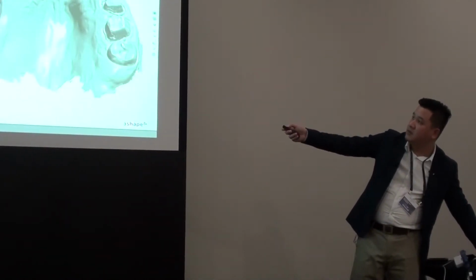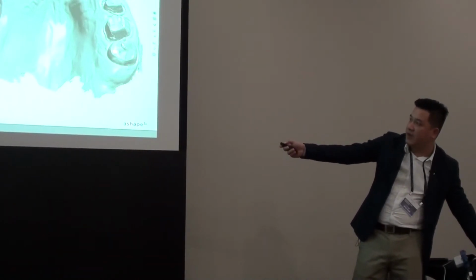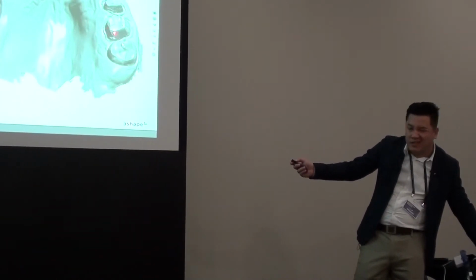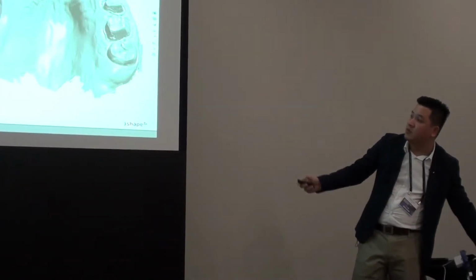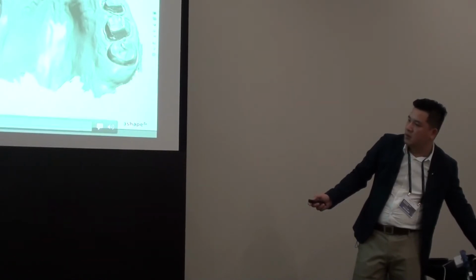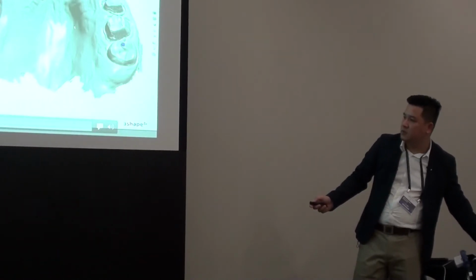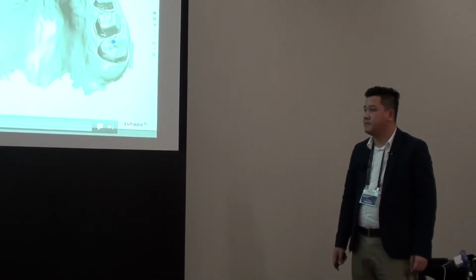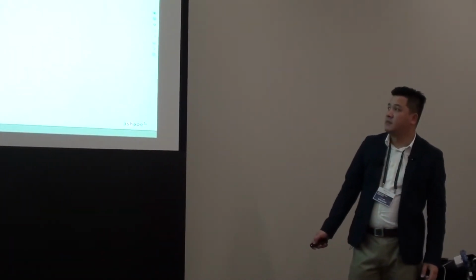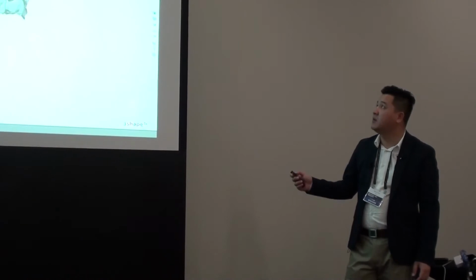So you mark these. If you have a full prep, these ones we happen to have to keep to maintain the vertical dimension. But if you have a fully prepped case, you can also use palatal landmarks. Not extremely accurate, but it does help, and you can always tweak it with the move tool at the end. Make sure everything is in alignment. I'm sorry, the video is not working for some reason. Align these two together. Make sure we're happy with the alignment of the upper. Same thing with the lower.